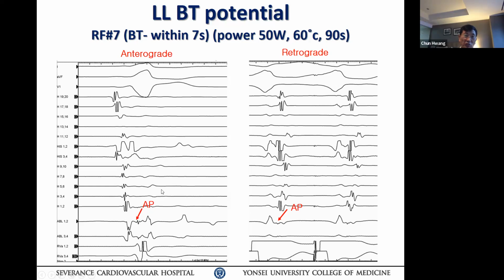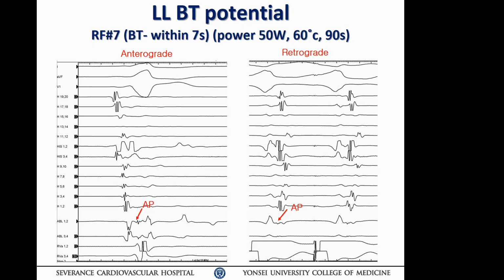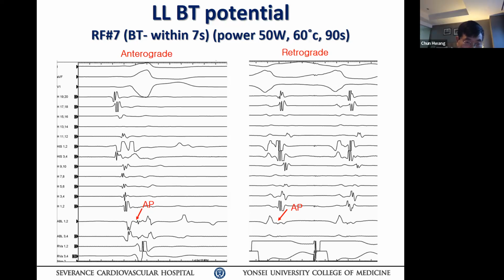You're not making any sense to me now. If you have a non-manifested accessory pathway or dominant pathway through the septum, and you're mapping left lateral pathway potential, is that what you're saying? Yeah. So you must have evidence that that left lateral pathway is conducting, I'm assuming.